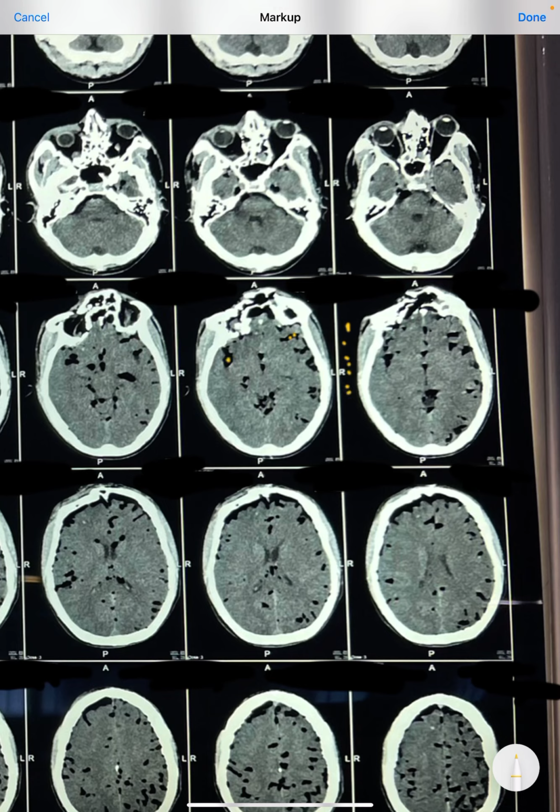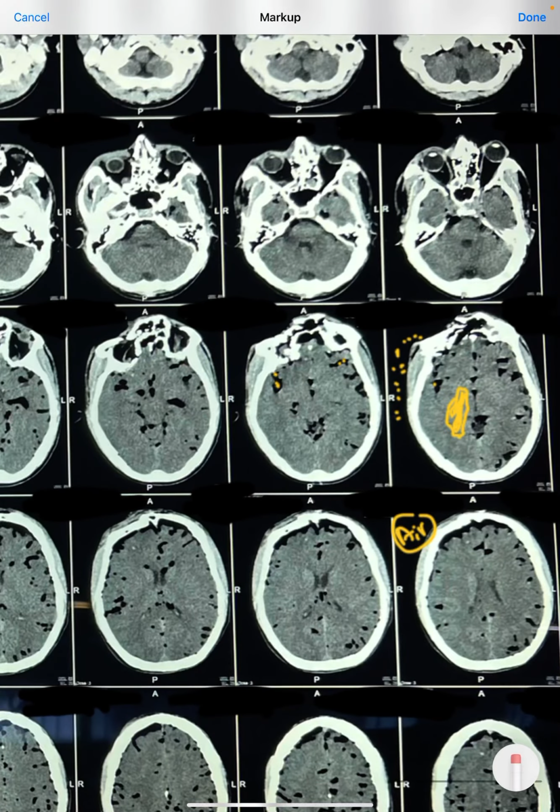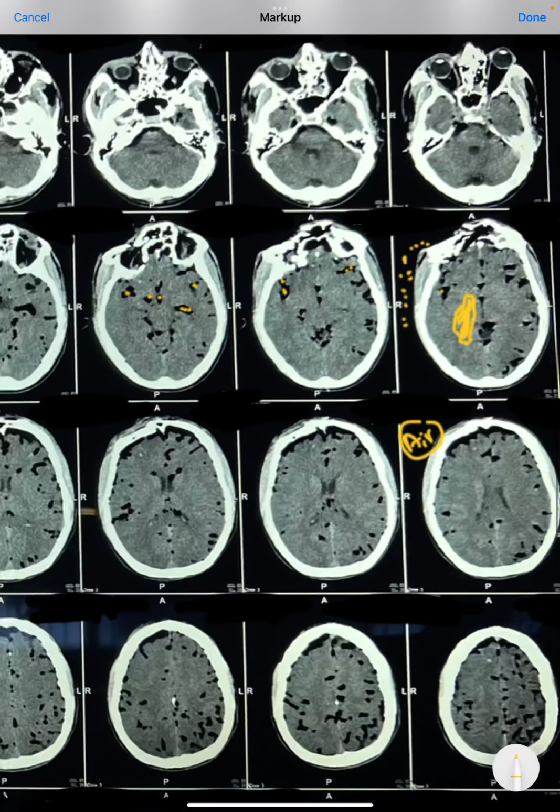This black is all air. This is all air, and this is also air, because on the CT scan the most black structure is always air, because soft tissue will always have some kind of whiteness or radio density. The subcortical structures also have a blackish tinge, but this black is much lesser compared to this. So this much dense black attenuation is always only of air.